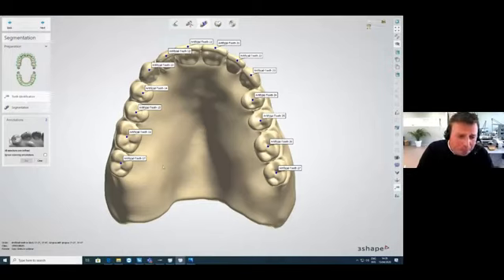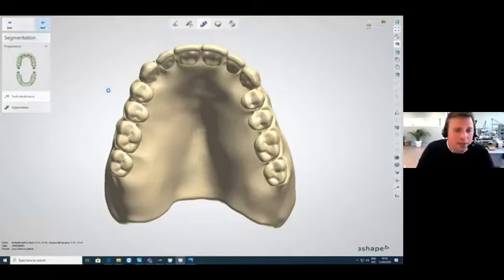And if you have only a denture with like 2 molars and 1 premolar, or 2 premolars and 1 molar, you always have to choose the 1/7. So if you don't have a 1/7, just place this 1/7 onto your gingiva, just on the denture. Doesn't make any problems.